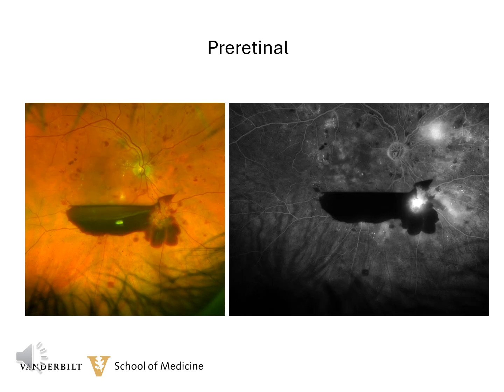Here's a patient with diabetes and a pre-retinal hemorrhage. This hemorrhage lies between the posterior hyaloid cortex and the internal limiting membrane of the retina. The clinical photograph shows a typical boat-shaped pre-retinal hemorrhage overlying the inferior arcade.